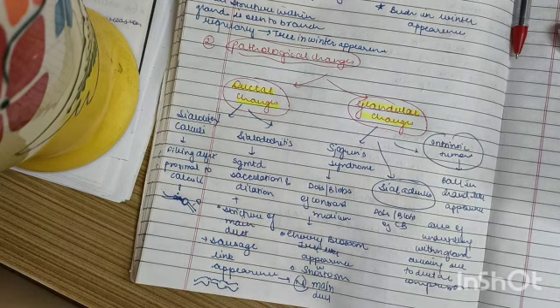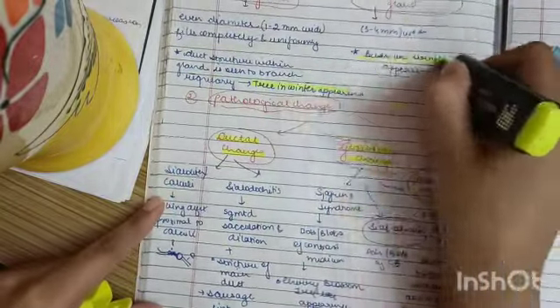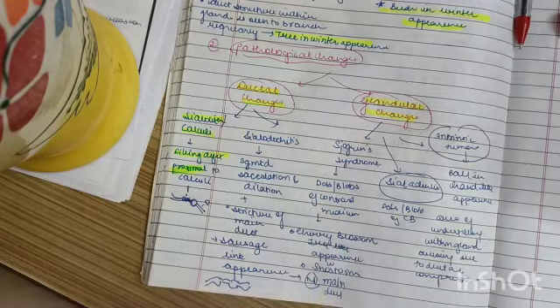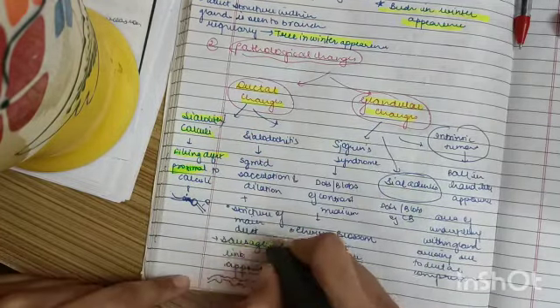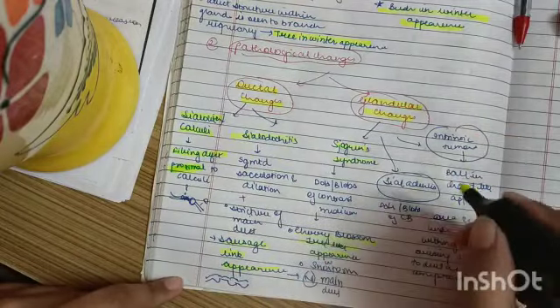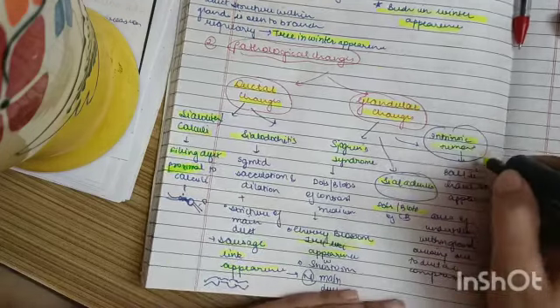Now I'll just highlight the keywords that you must remember. For the normal parotid gland, remember the tree in winter appearance, then the bush in winter appearance for the submandibular gland. In sialolith or calculi, filling defect proximal, very important to remember the word proximal. Sausage link appearance in sialodochitis. In Sjogren syndrome, we have the cherry blossom tree-like appearance. In sialadenitis, dots and blobs of contrast medium. In intrinsic tumors, ball in hand appearance.